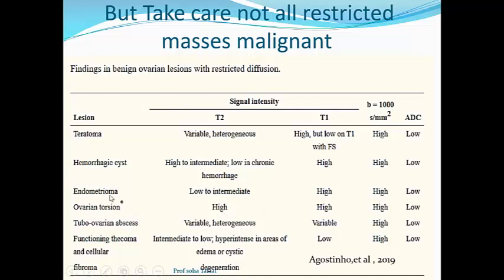Ovarian torsion is high on T2 due to the edema present, high on T1, and it is restricted on diffusion, sometimes due to impending infarction and edema.